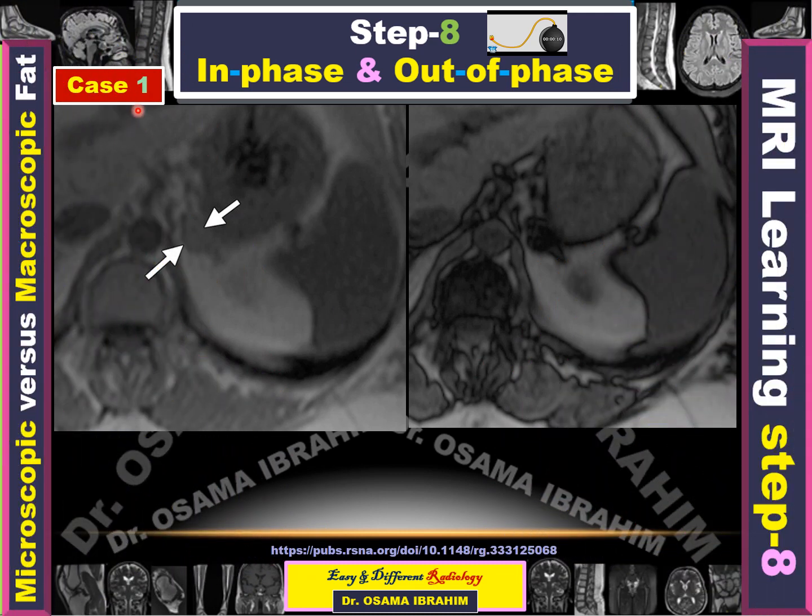Case 1. As I mentioned, I give you 10 seconds to recognize which one is the opposed phase, as I described before. Then answer the following two questions: macroscopic or microscopic fat, then the detection of the diagnosis.